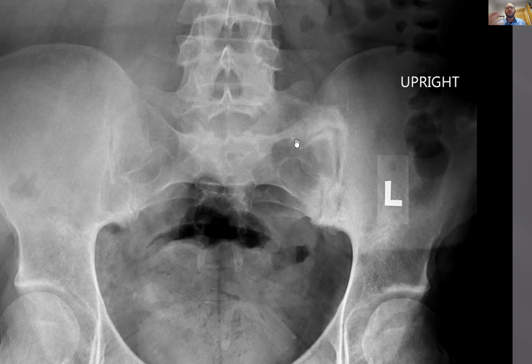And those changes cause asymmetrical Wolff's Law load across the SI joints. It was so significant in this case that it caused increased motion over there. And then that, of course, laid down bone and created this abnormal, almost nasty-looking SI joint. That's all stress-related biomechanical change.